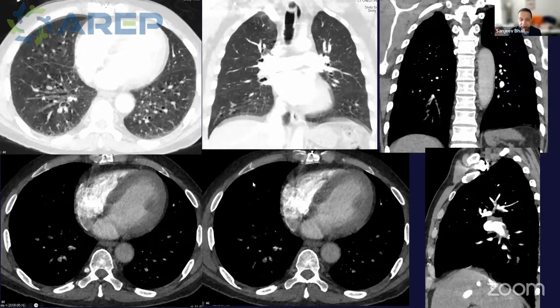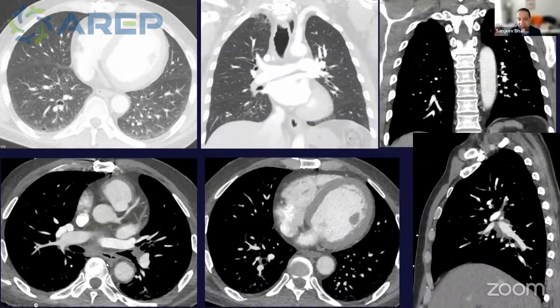Here was a patient who was brought in who we thought might have a pulmonary embolism in the lower lobes, but when we looked at the lung windows, you could see there was a lot of motion artifact. Well, we called the technologist and asked what was going on. She said the patient had hiccups. So the patient was hiccuping during the examination. So we brought the patient back when the patient's hiccups had stopped, and you could see that all of these were flow-related phenomenon. Now, by the way, this was done with a high pitch mode to try to overcome any potential of any motion artifact.